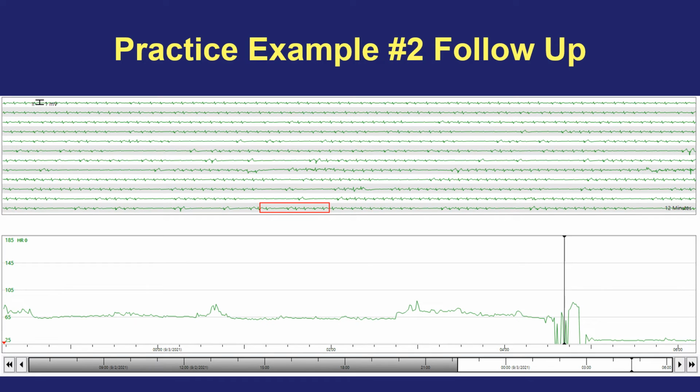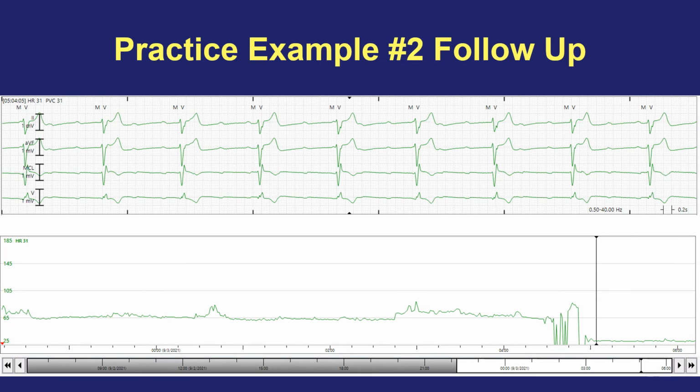If you look at the telemetry over time, you will see that there are these pauses which increased over time. And then you'll look at the heart rate trend. This is where the pauses are occurring, where you're having a heart rate of 0 temporarily and coming back up. And then you plateau at this rate in the low 30s. What happened there? Let's review by clicking on that part of the telemetry and looking at what is the heart rhythm during that time.